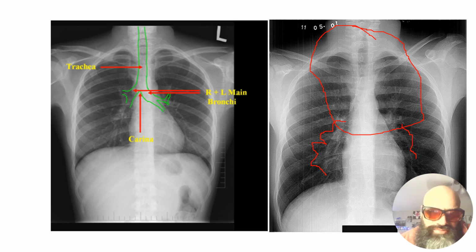And as always, keep this in mind at all times: your bronchi should be invisible on a normal chest x-ray. The bronchi walls are very thin, they have air inside of them, and they are also surrounded by air, so you should not have any visualization of the bronchi in a normal chest x-ray. But when you start noticing infiltrates within the regions of the bronchi and the alveolar regions, then you know there is some sort of fluid density that has infiltrated the area of the normal structures.